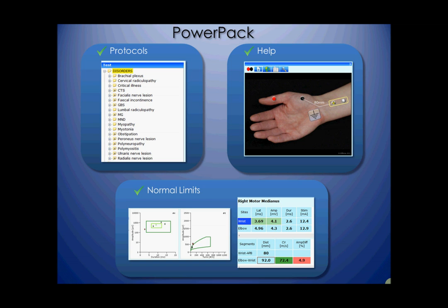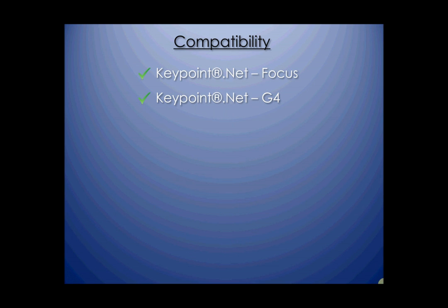It's an additional separate program that installs in your EMG system. It contains several powerful modules to extend the functionality and get a better and faster examination workflow. PowerPack is currently compatible with the following EMG systems. Let me show you some of the functions included.